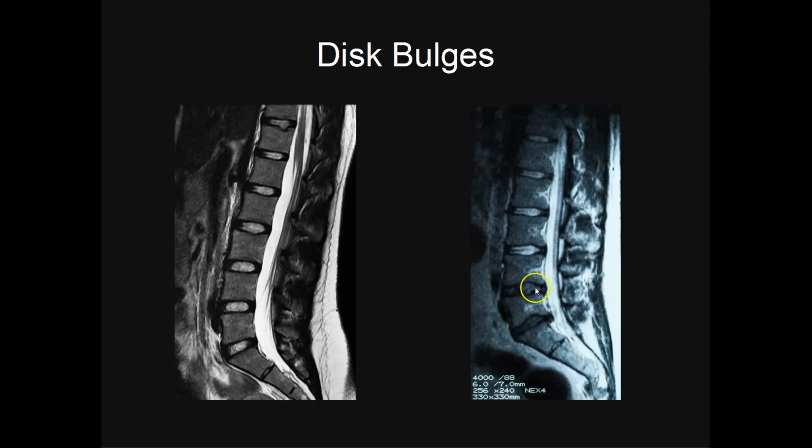It kind of forces its way out from the material, and actually kind of snakes its way out until you get a bulge here. And then if it goes on for long enough, we actually start to get a proper herniation, which is what we've got here. And you can see, especially in this one here, there's quite a lot of disc fluid compared to this side that's actually leaked out, and you can see that it's impinging now on the spinal nerve.